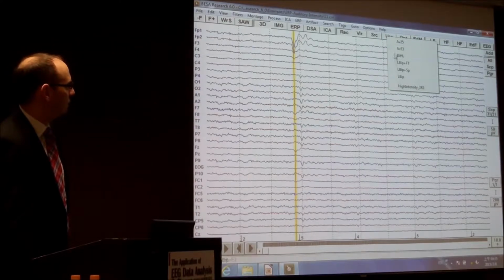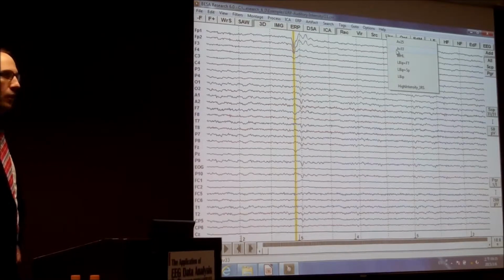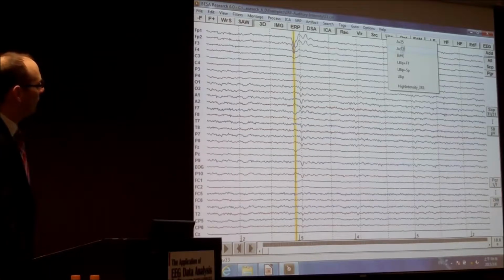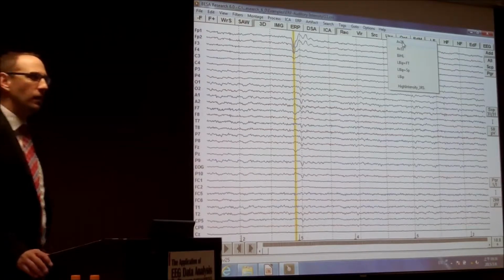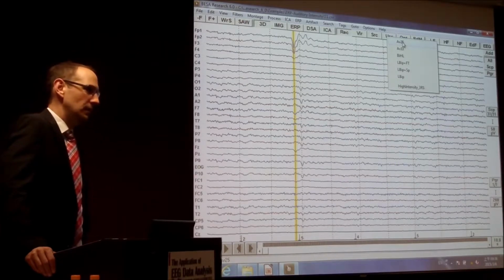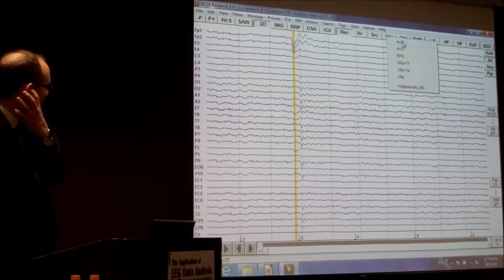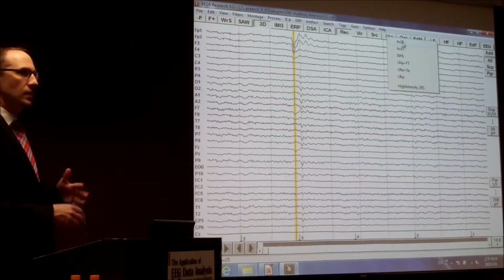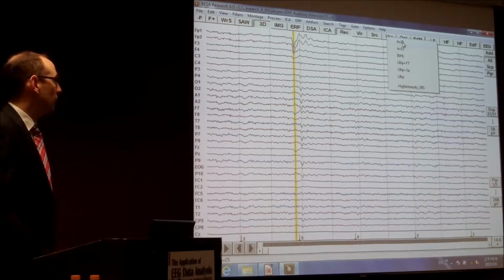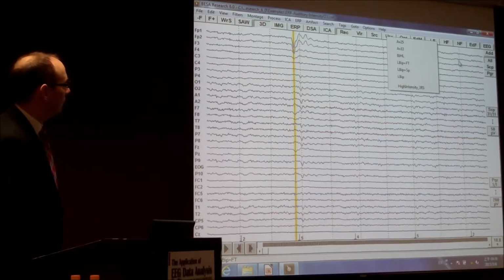We have some optimized montages like the AV33, which is basically made for epilepsy review. And we have the AV25, which is also made for epilepsy review, but with MEG data. So MEG data is a little different than the EEG data, because we have a radial blindness of the MEG, so the data looks different. Okay.